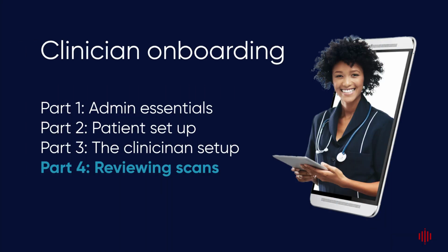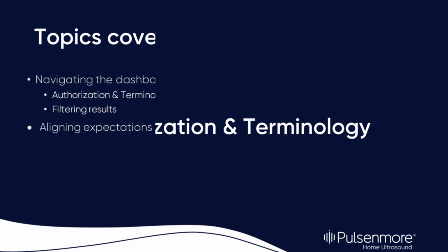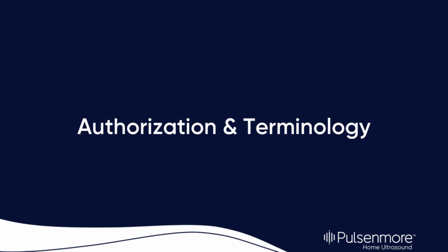In this session, we will guide you on how to review scans on the Pulsenmore ES ultrasound system, and we'll cover the following topics: navigating the dashboard, authorization and terminology, filtering results, aligning expectations, scan assessments, demonstrating scans and reports download. Let's begin by reviewing some terminology used across the clinician dashboard and reports, and gain a deeper understanding of the different privileges of authorization.